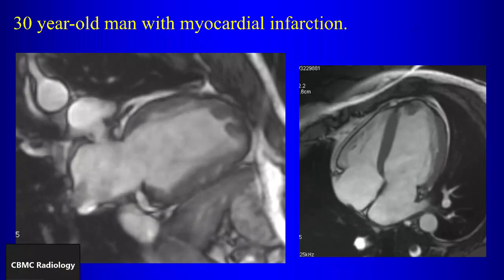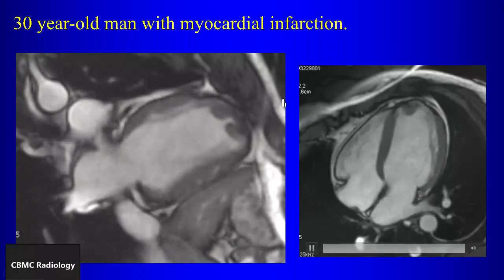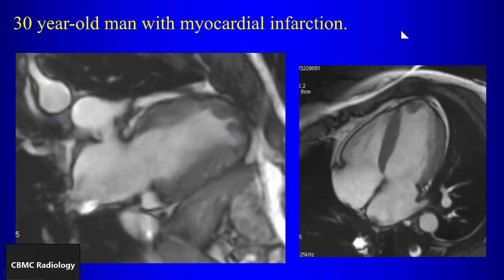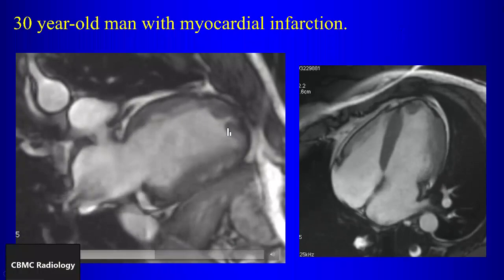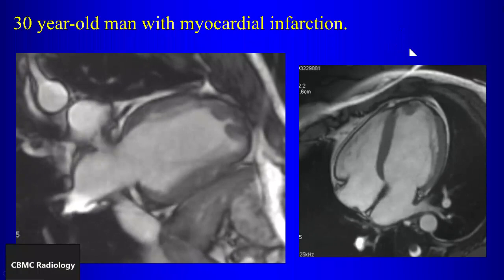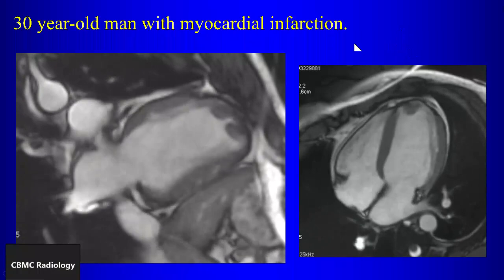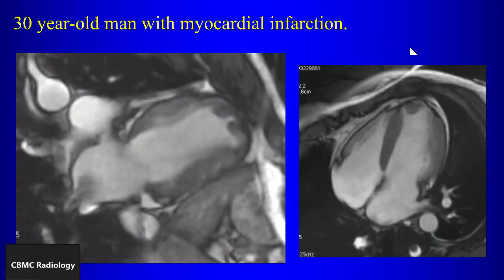There's apical hypokinesis with filling defects. Yeah, so maybe even dyskinesis here in the apex of the left ventricle. Does that surprise you given the history? No. And you say there are filling defects, right? So what do you think those filling defects are? Thrombi. So is this a setup for thrombus? Somebody who's had an infarction and has an abnormal wall motion at the apex.